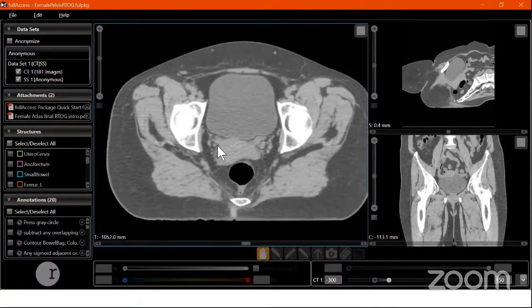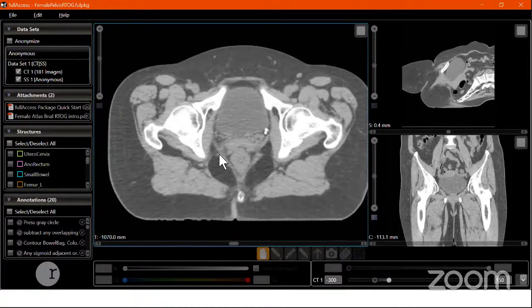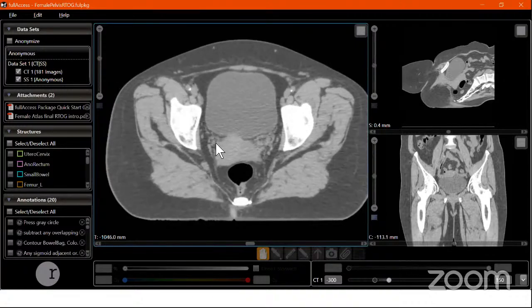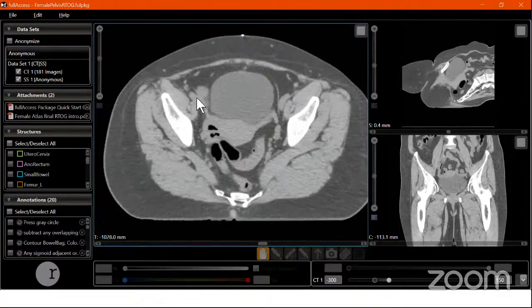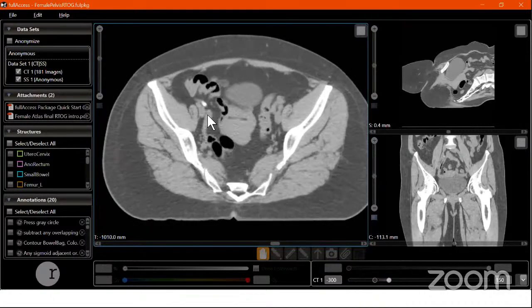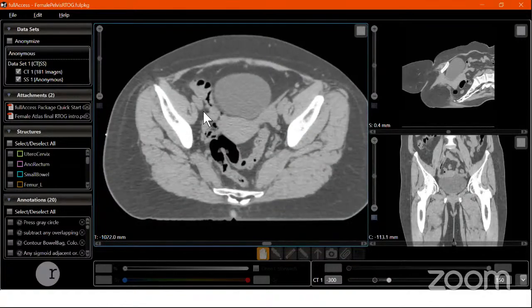The internal iliac ultimately divides down finally into the pudendal artery, and then it comes out of the pelvis. One of the divisions is the pudendal arteries, right? So after we have done a 7 millimeter expansion, the modification required is that we connect the spaces between the external iliac and the internal iliac to cover the obturator group of nodes. This obturator group of nodes is going to be contoured right from the place where the external iliac and internal iliac bifurcate from the common iliac. So the space between these two is going to be connected. And when we talk about connection, we are going to connect.